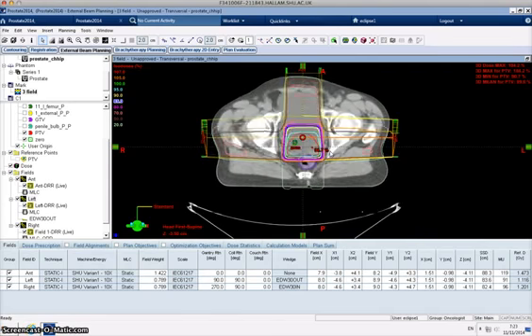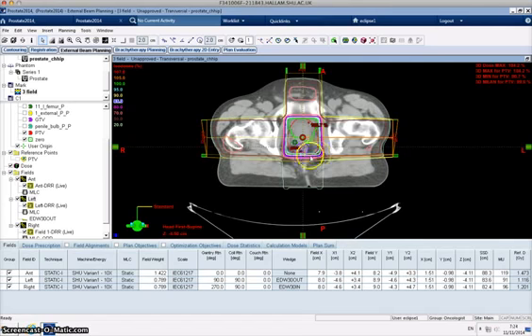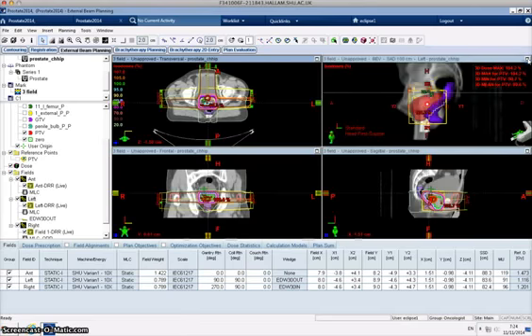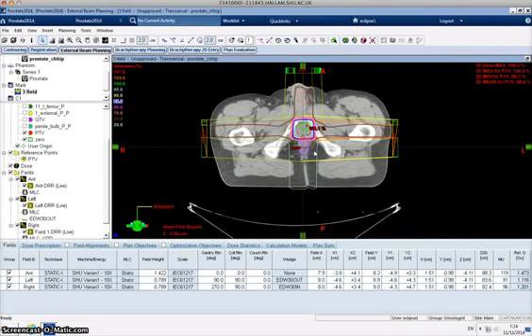So we're looking for a general kind of dose distribution in terms of our 95 to 107. We can see here that in lots of places this conforms quite nicely. Again, we're limited to this box shape, but as we get to this point here, we can see it's the superior slices up here where we're underdosing the PTV, and if we look inferiorly, then again we're a little bit tight on there.